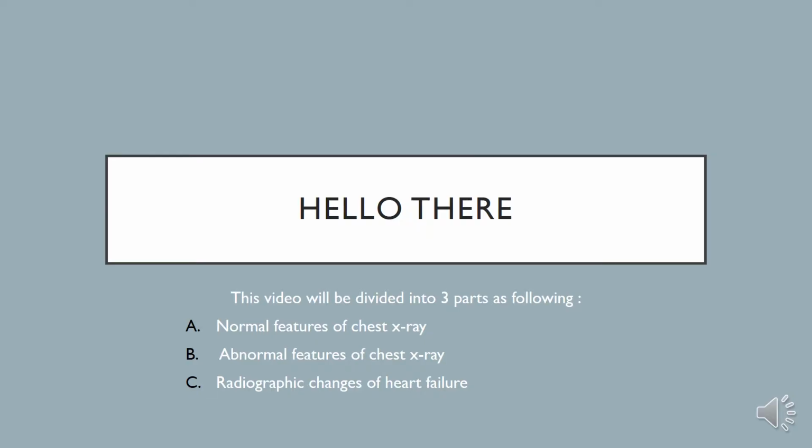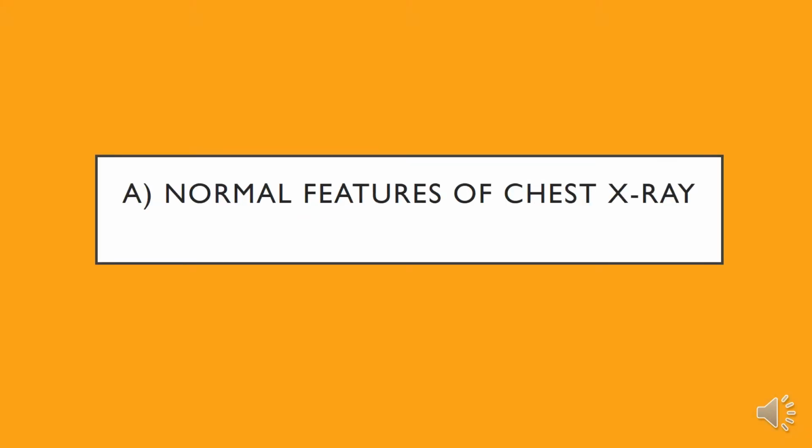Hello there. This video will be divided into three parts as following: normal features of chest X-ray, the abnormal features of chest X-ray, and the radiographic changes of heart failure. Now we will talk about the normal features of chest X-ray.